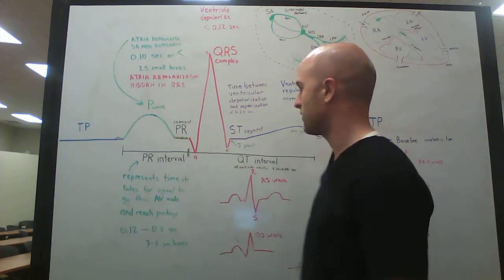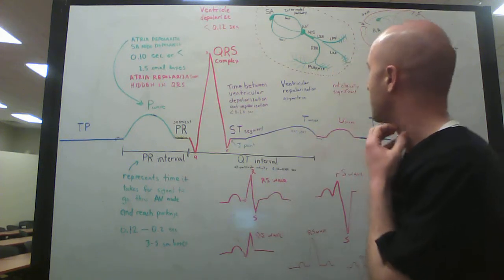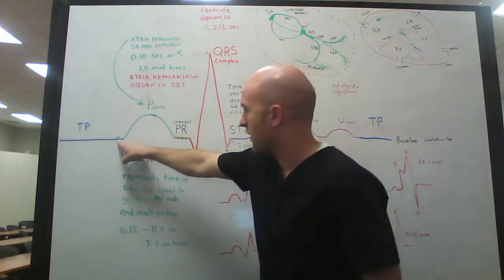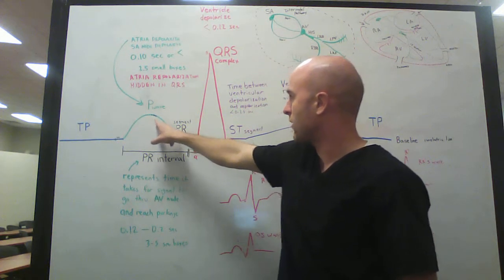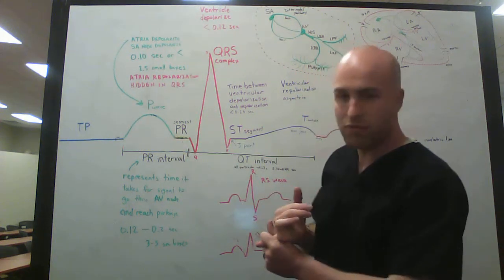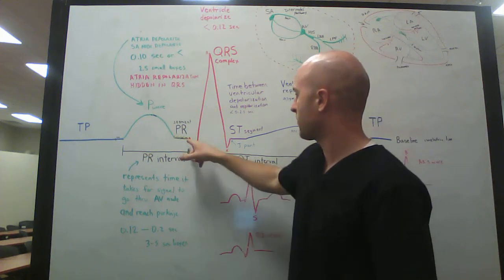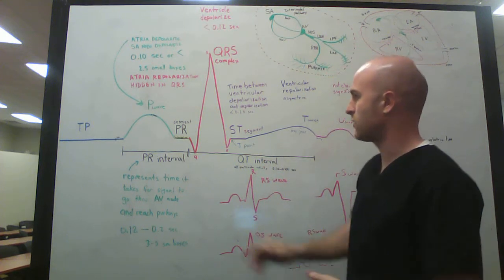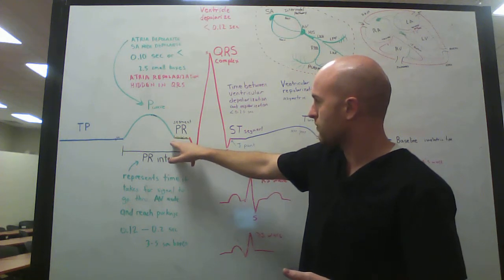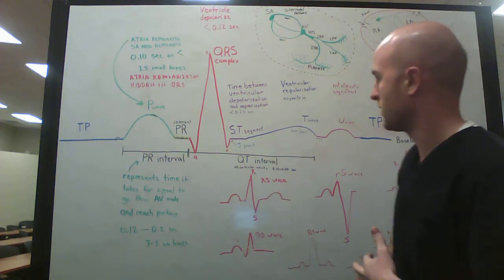During the PR segment, there are actually a lot of things occurring, because remember that ultimately ventricular depolarization is the goal here, but it has to run through the electrical conduction system of the heart. Following the SA node firing, the atria fire. The PR segment is going to be the AV node firing, the bundle of His firing, the left bundle branch and right bundle branch firing, and the Purkinje fibers firing. So this PR segment basically traces everything starting at the end of the atrial depolarization all the way to reaching the Purkinje fibers depolarizing.